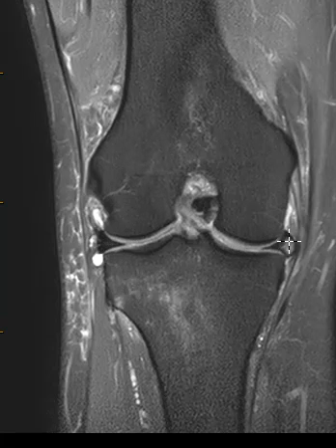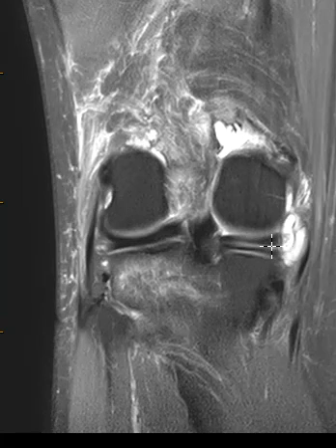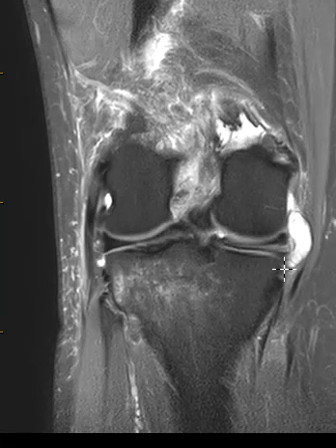On this side, the meniscus looks a little bit different. It's foggy over here, kind of expanded, and if we go backwards, we see this horizontal tear within the substance. It looks like the tear goes right into this fluid collection. So this is what we call a parameniscal cyst.